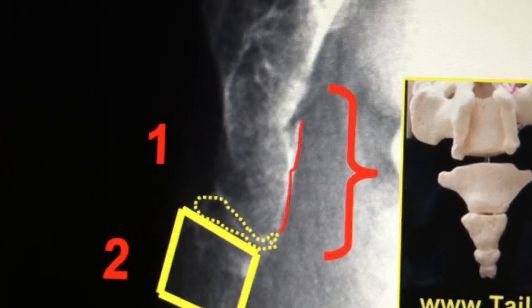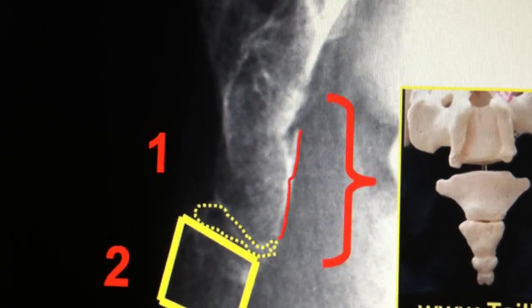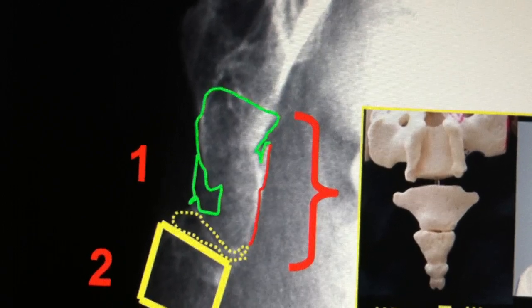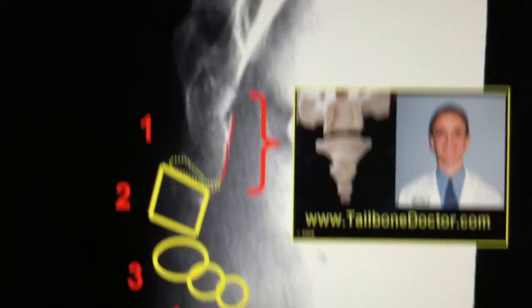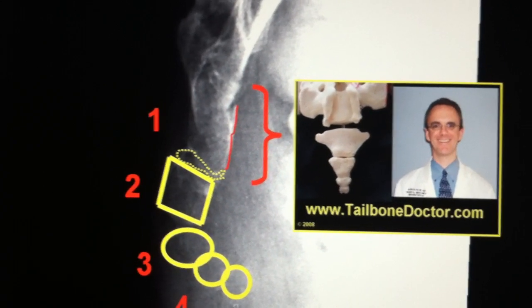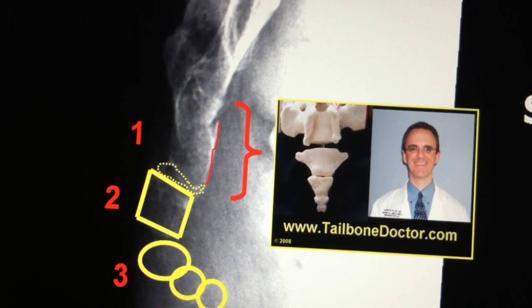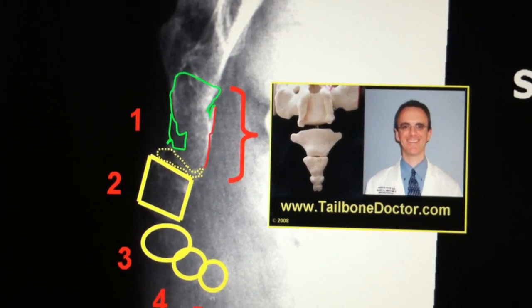And notice how at the top of that red line it all gets a little broken down, because you don't have a nice smooth area where the bone is going next. In fact, as I've drawn it in green here, the borders become very irregular, and it's not so clean and crisp to make a nice well demarcated shape the way that we had in those lower coccygeal bony segments. That is because the patient had a fracture at that first coccygeal segment.